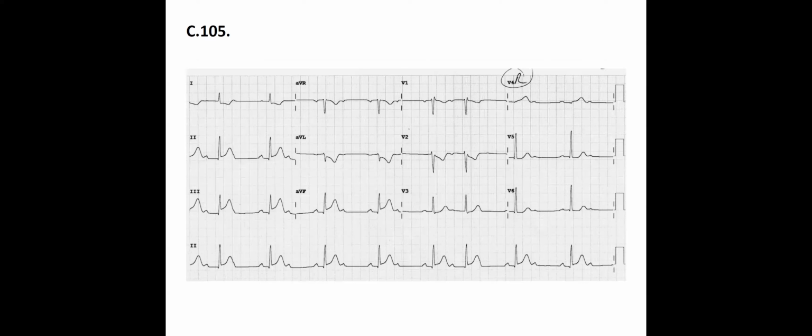It's a bit similar to what she said, but in mine, I saw that I have bradycardia. It's arrhythmic, and I was a bit confused.